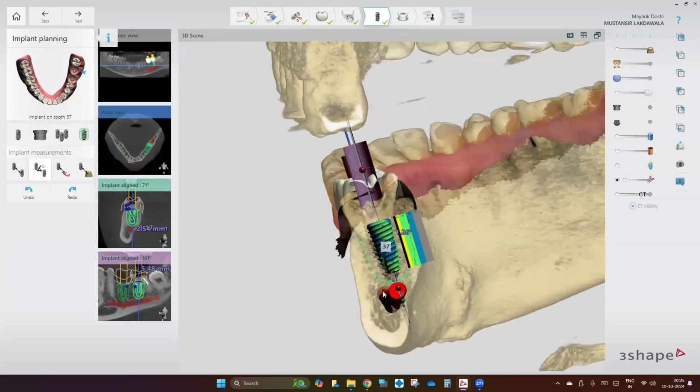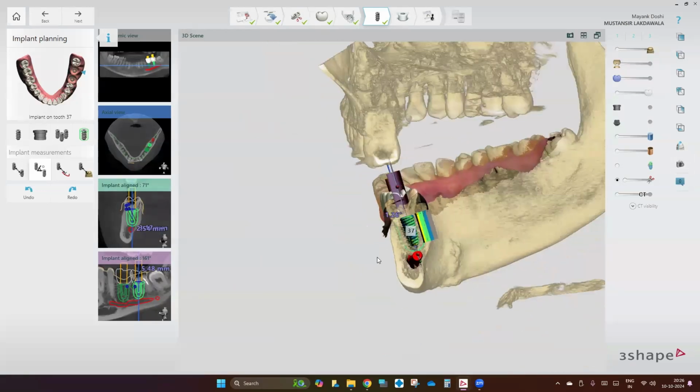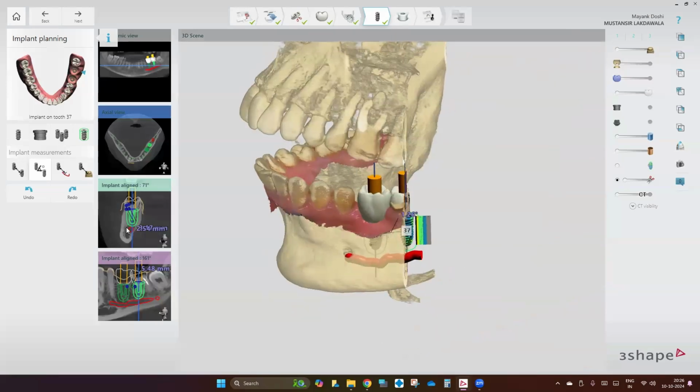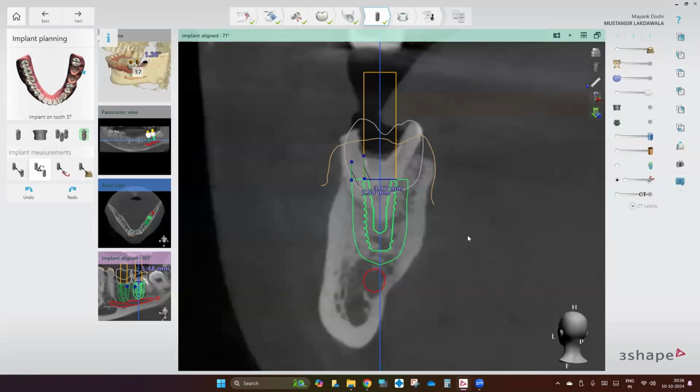It shows here also as a cross section where it comes. चलो, अभी मेरे को नहीं मिल रहा है, because I understand that you guys will require it to mark and give it to them. So these are some extra features over here which at a later date you can try and explore. उसको अभी हाथ मत लगाना other than the measurement part of it. Okay? ये रहा.